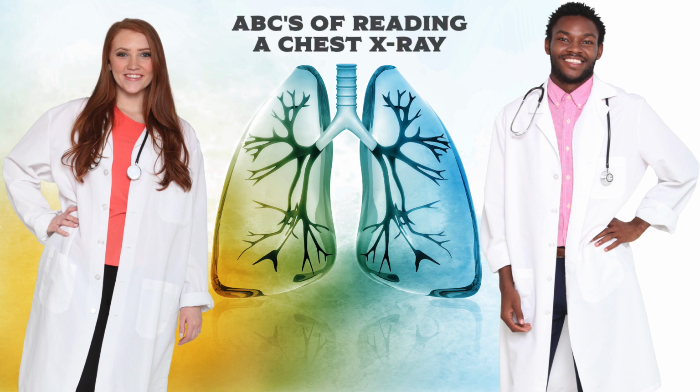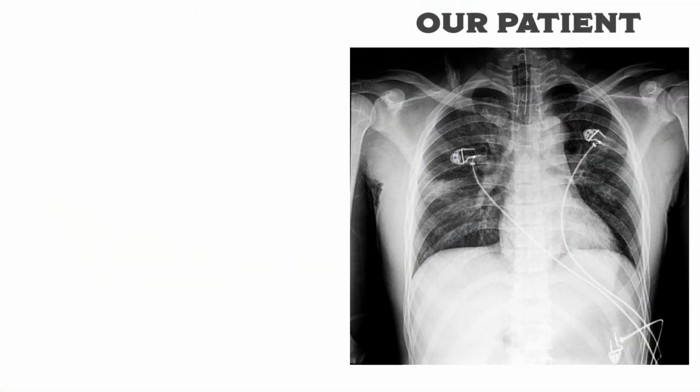As a respiratory therapist, a key skill you will need to develop is to be able to read a chest x-ray. Let's go through the ABCs of reading a chest x-ray. Here's our patient's chest x-ray.